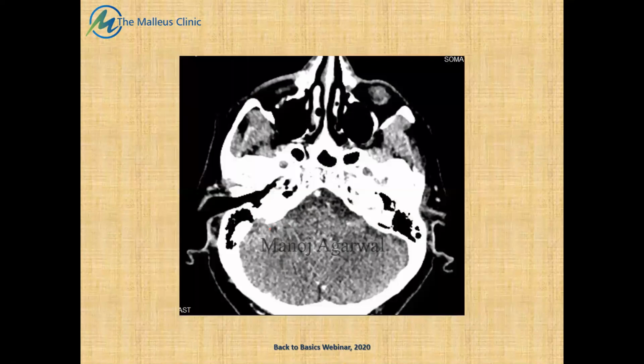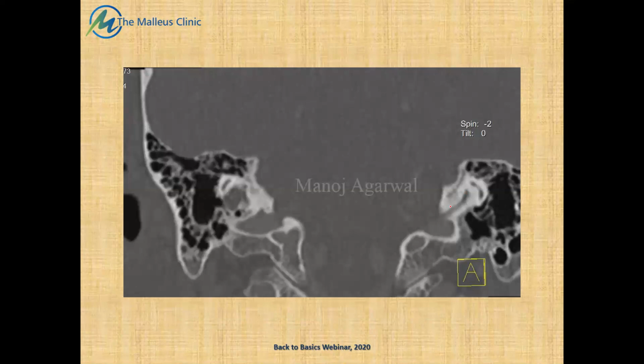into the mastoid cavity. This is the coronal section. You can see the posterior semicircular canal, and you can see the vestibular aqueduct. Vestibular aqueduct on the left side, which is absolutely normal, but the vestibular aqueduct is eroded and it's occupied by a mass in close contact with the posterior semicircular canal. Okay, you can very clearly see the lesion on the right side.